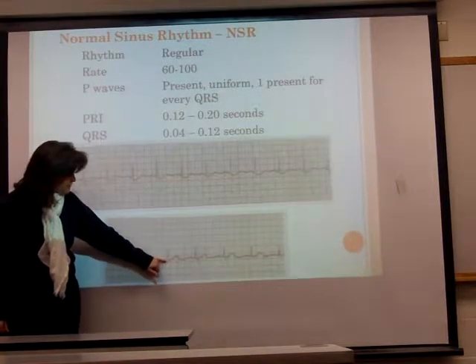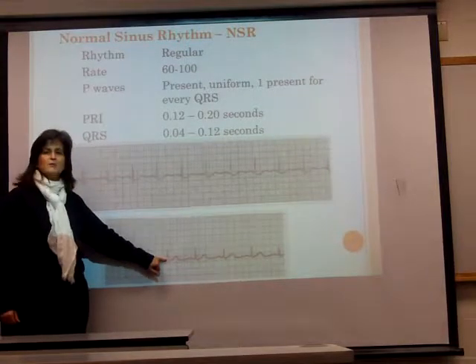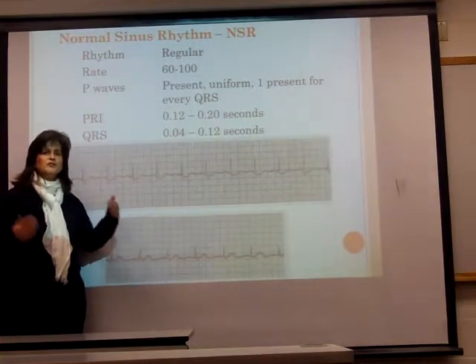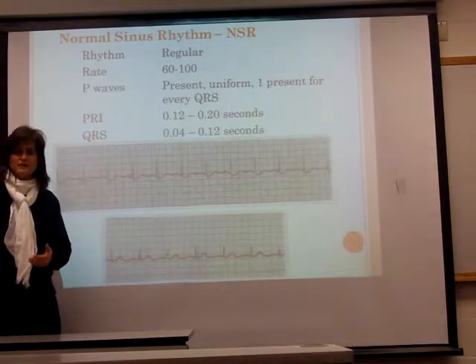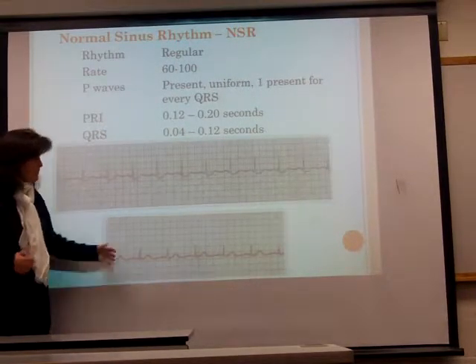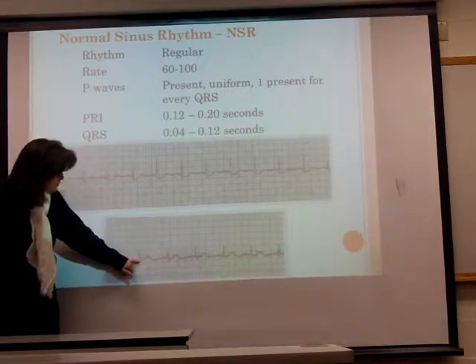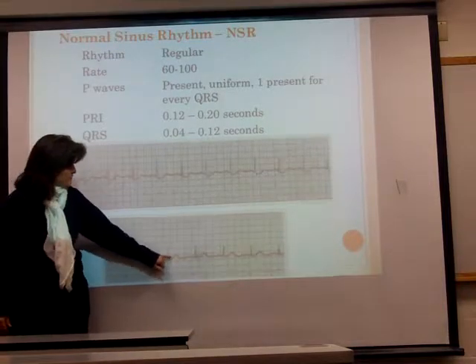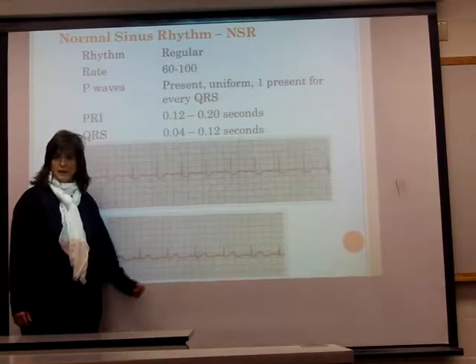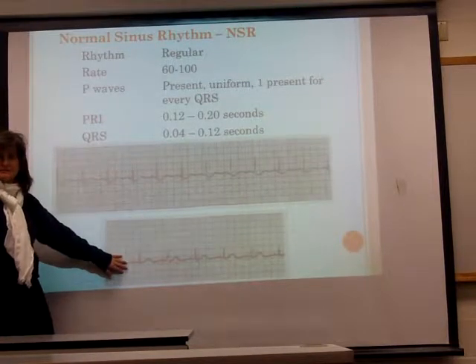The ST segment here is slightly involved. Clinicians would say that's about a 1 millimeter depression, which can be clinically significant if there's other things showing that the heart is otherwise stressed. But it still needs to be reported as a potential depression. Our QRS is about 2 boxes, so 0.08. Our T wave is present, and it's certainly not peaked, and it's upright. So the only abnormality here is a slight ST segment depression.